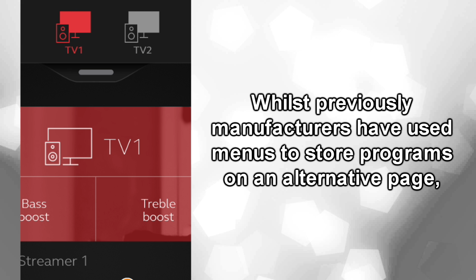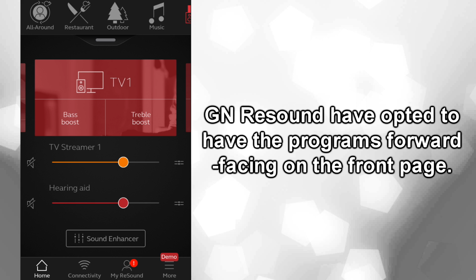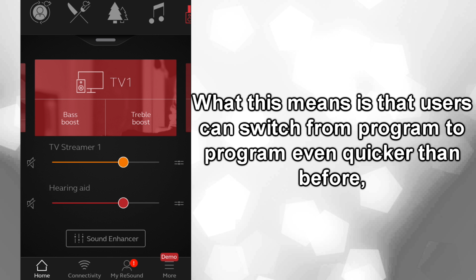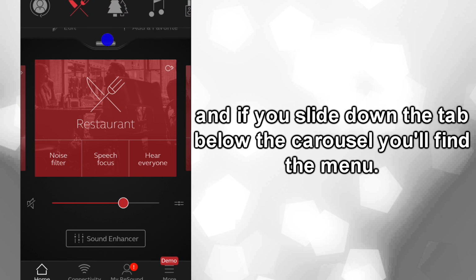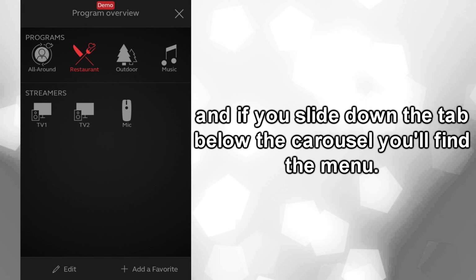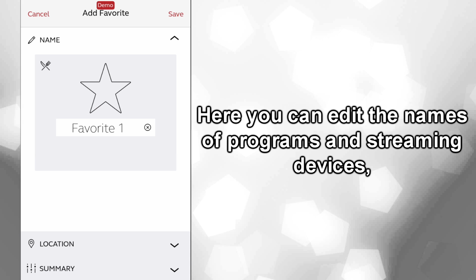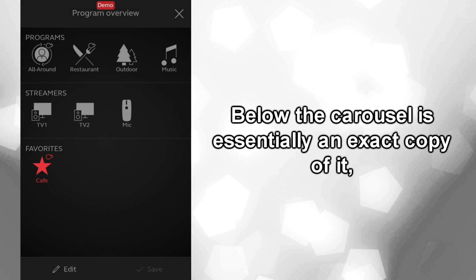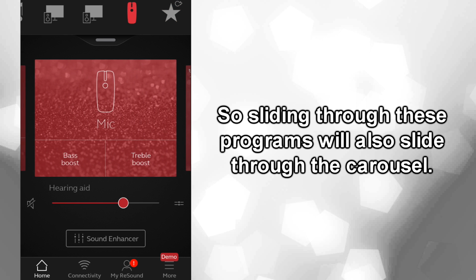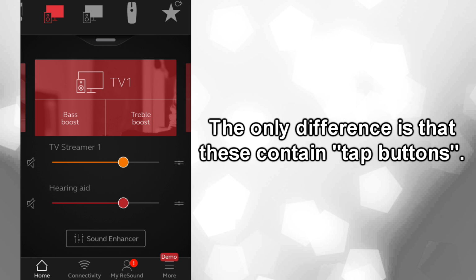Whilst previously manufacturers have used menus to store programs on an alternative page, GN Resound have opted to have the program forward facing on the front page. What this means is that users can switch from program to program even quicker than before. And if you slide down the tab below the carousel, you'll find the menu. Here you can edit the names of programs and streaming devices, as well as add favourite programs which you use the most. Below the carousel is essentially an exact copy of it, so sliding through these programs will also slide through the carousel. The only difference is that these contain tap buttons.